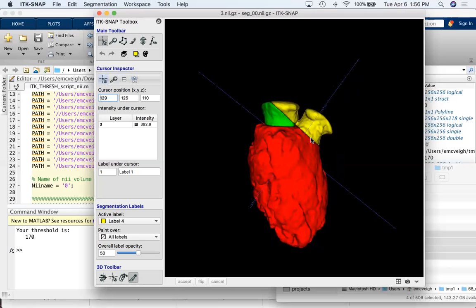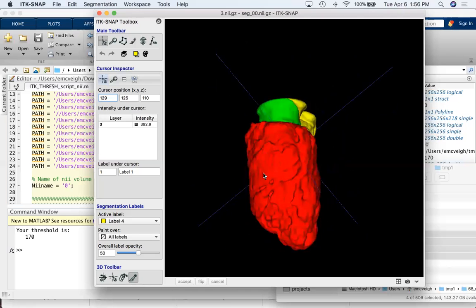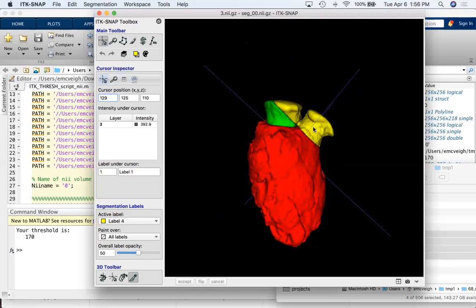Gabby and Ashish tell me that if you leave this, it'll slow the thing down a little bit because it does some processing on the whole volume. But I think I kind of like these things at the top. They give you a nice orientation of what's going on. The problem is that when you play a movie, the top of this thing bumps up and down because nobody cares where it is, right?